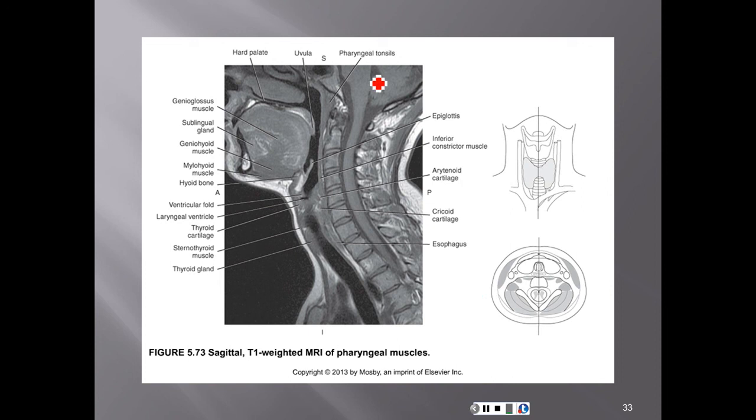Of course, the ones I didn't discuss yet, the uvula, but we should be aware of the uvula. Sternothyroid muscle, and the muscles that act in or around the thyroid and the hyoid bone. Otherwise, we discuss many pieces of anatomy that's in this picture.